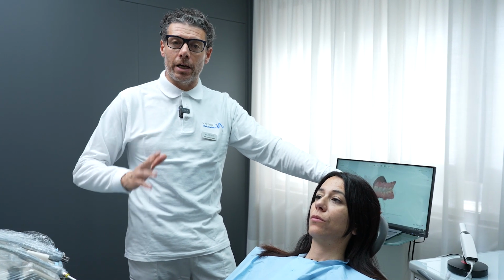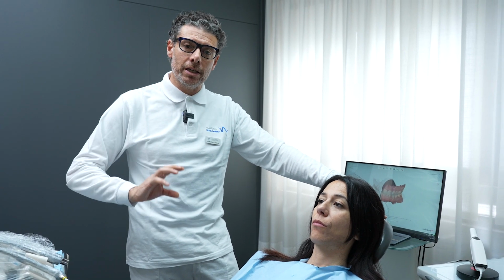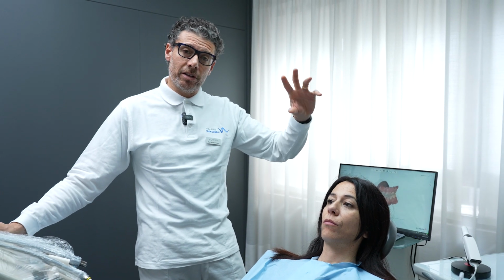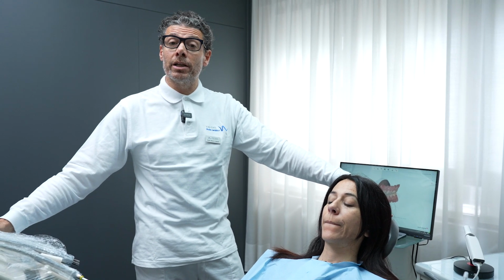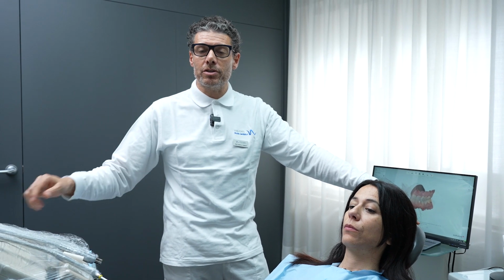This is an important step for the first superimposing method because the files should be sent with the 3-shape Communicate software so that the RayFace scanner software can get these scans from the Communicate cloud, which I remind you is the communication tool between the TRIOS and our lab.